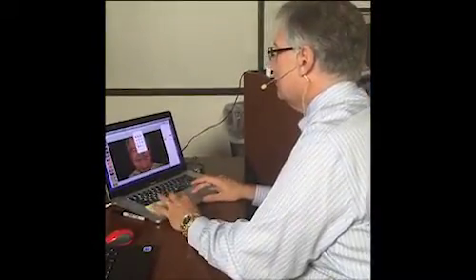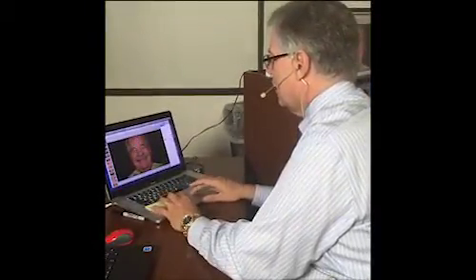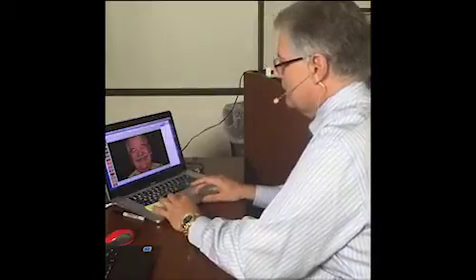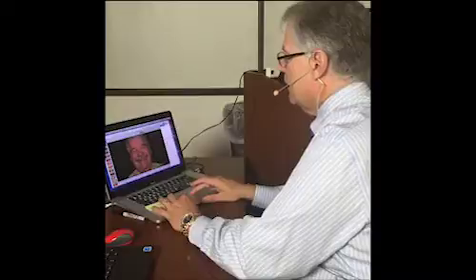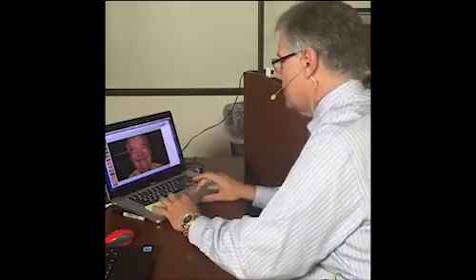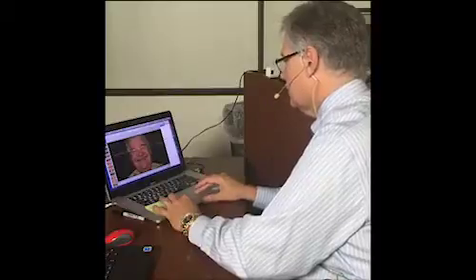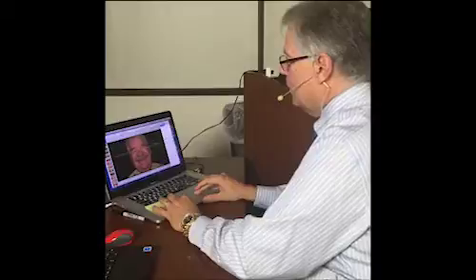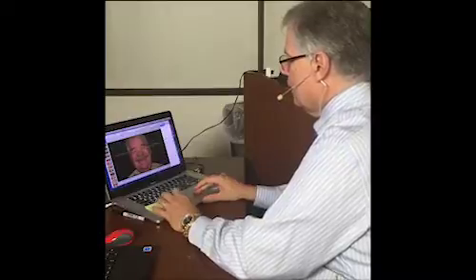If you come here and you want to do a line, you click here and it'll let you draw a line, and this one usually actually works. That's 0. Now it's telling me 0, and that's a horizontal line. That's following. So that's the glitch. If you had an existing shape, some of those shapes will give you some wrong numbers. So this one, it's at 0. At 0, what do I know? Where should both pupils be? So I'll kind of go in the middle.